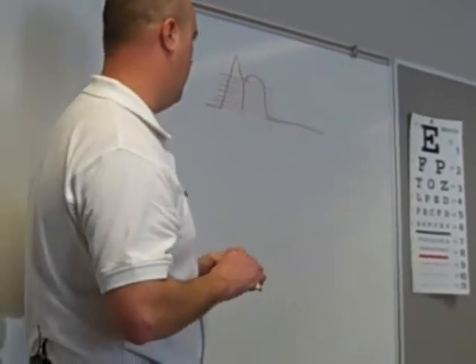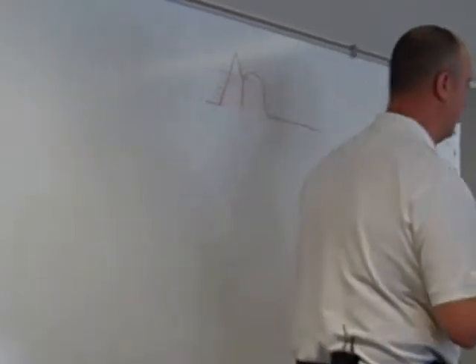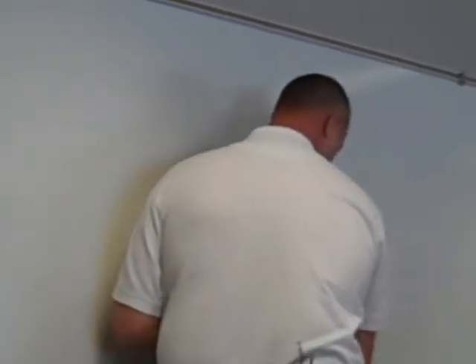Normally, real low, 1 to 2 millimeters of ST elevation is not anything to get really concerned about. When you start getting more than that, though, that's really significant, like our two sentinel leads right there. Time to start raising concern.